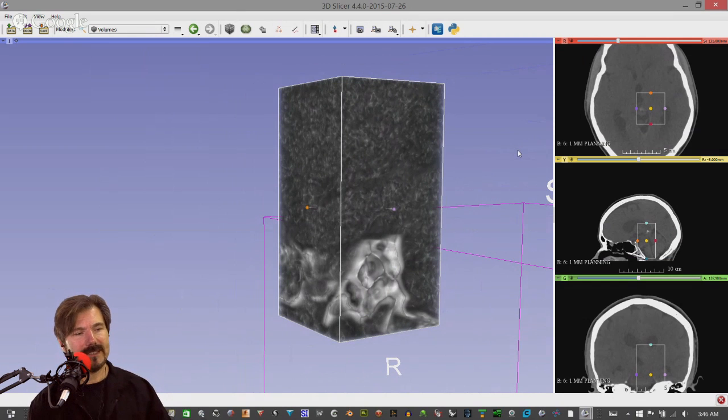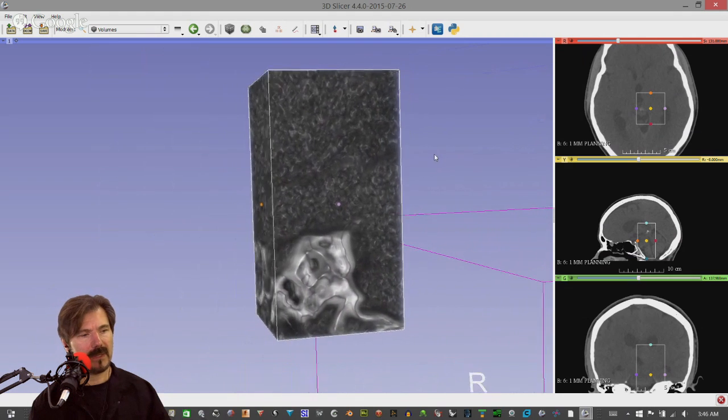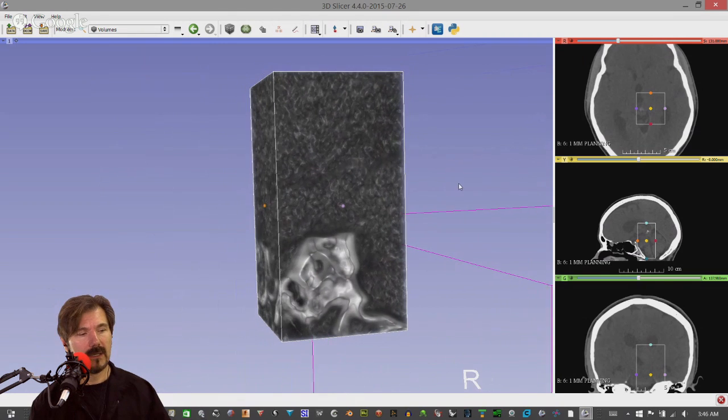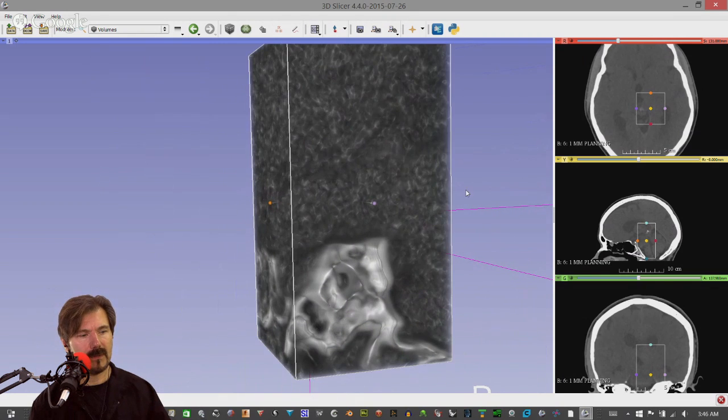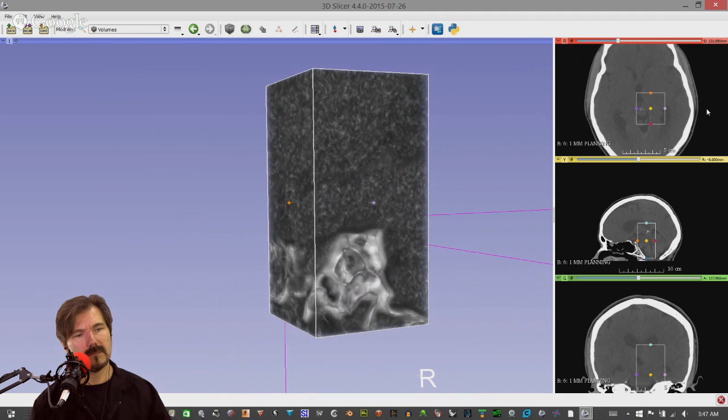So again, this is a CT scan. So if it's illuminating, well, has this already been diagnosed? Do you know exactly? Well, the illuminating, the enhancing, has to do with whether contrast was given. And usually masses in the brain do have enhancement with contrast. And I do know, spoiler alert, that this will be a thalamic mass. I don't know what type of tumor it turned out to be, because I don't know if they ever biopsied it, but it will be a thalamic mass. Okay.